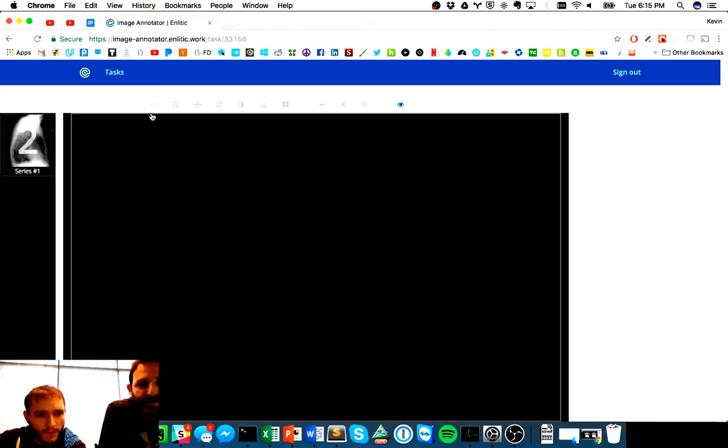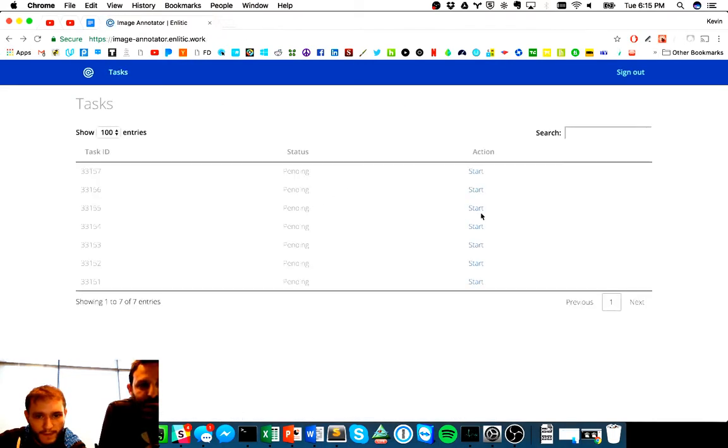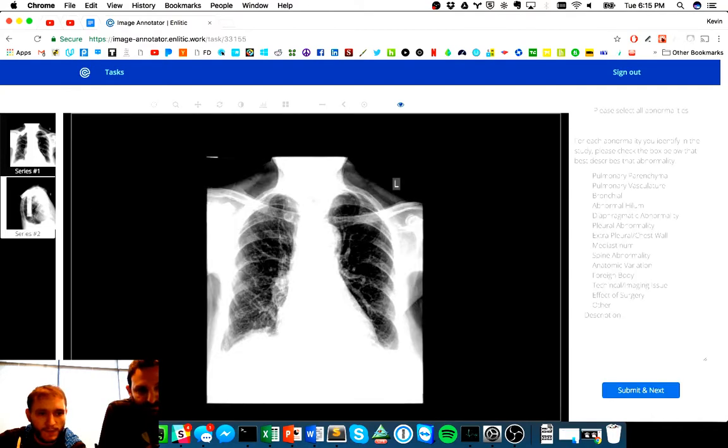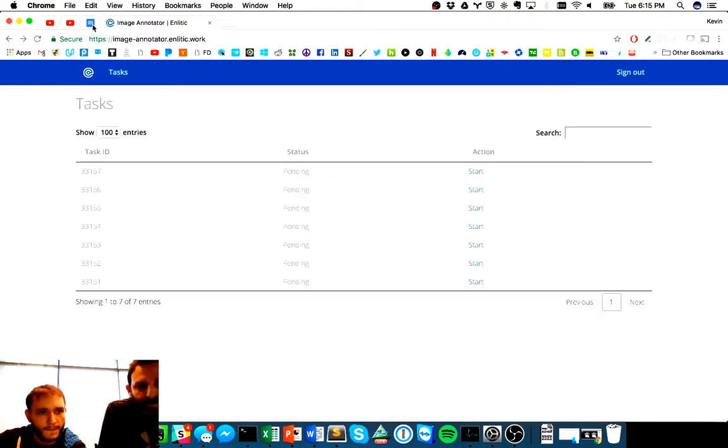And we could see real quick if this one's also got 2 in the series. Let's try to find. And here we can see an example of a case that has 2 separate series, each of these series only having a single image in it. That's really the only 2 ways that this scenario would present itself. You'll either have multiple series or multiple images in each series.